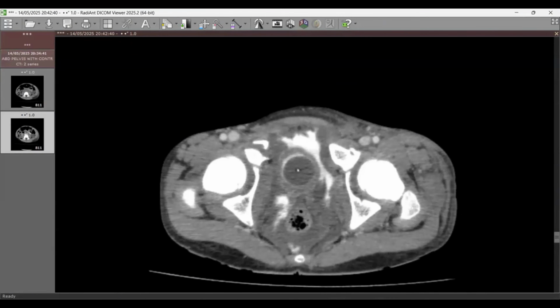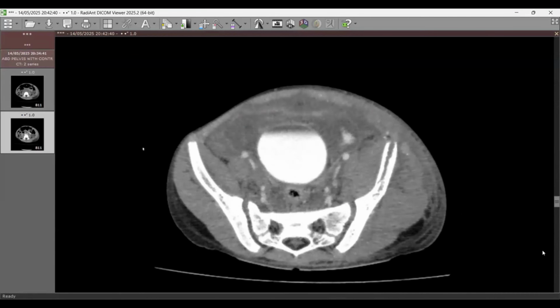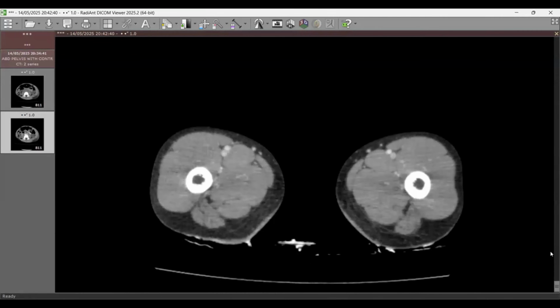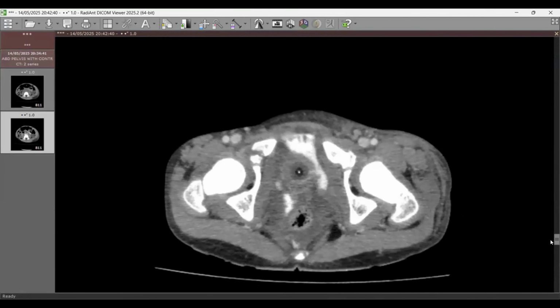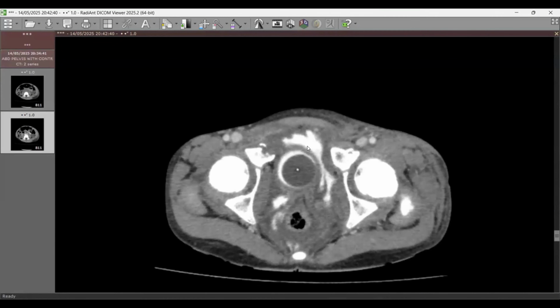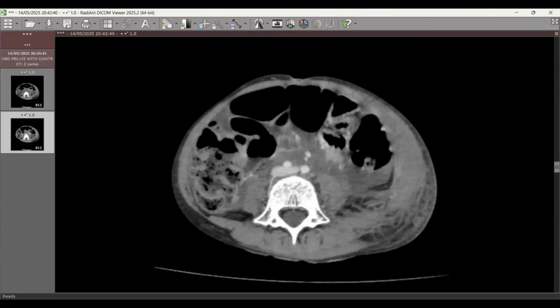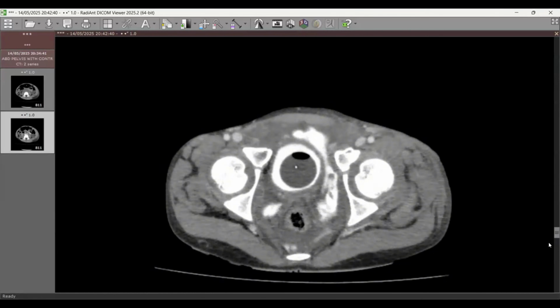Of course, the pelvic fractures were very important in this case. But first, you should have completed all the soft tissue findings and then asked for a bone window rather than commenting on bones on the soft tissue window. This is a very rookie mistake, but needs not to be done. There were fractures of the pelvic rami too, here and here, which you were not able to identify, but the rest of the description was quite good. This was a case of extraperitoneal bladder rupture.